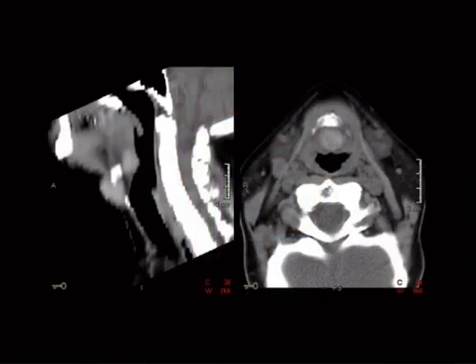So again, we've got an axial and a sagittal CT, but this time you notice that it's non-contrast. And I pointed that out because I want you to look at the thyroid tissue, or this dense tissue here, and be like, hey, that looks like that's enhancing. Well, it's a non-contrast study. So why would it look dense like that? You may or may not have ever noticed that on non-contrast CTs, the thyroid looks dense.